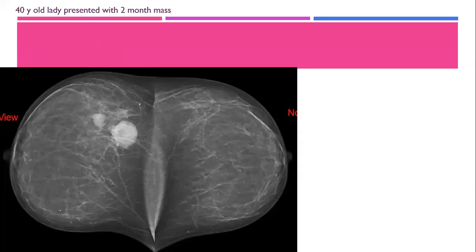A 40-year-old lady presented with a 2-month palpable abnormality. This is a view of this lady.